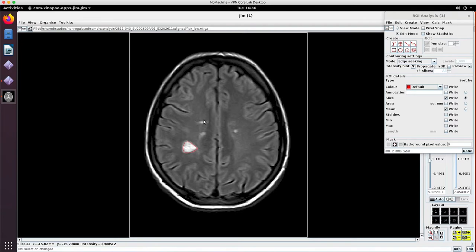So what we're going to be doing on a day-to-day basis for this kind of T2 lesion analysis is actually fairly straightforward. We're basically looking for abnormal bright things on T2 FLAIR-weighted images like this. Specifically, we're looking for abnormal T2 lesions, which almost always also are bright on FLAIR. They may occasionally become dark when there's extensive pathology that makes the tissue look like CSF. We'll discuss that later. But in general, we're looking for these bright areas on FLAIR, and trying to distinguish between false positives, false negatives, true positives, and true negatives.